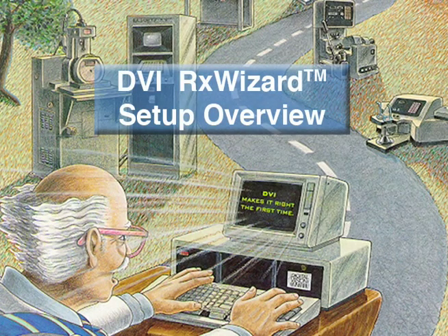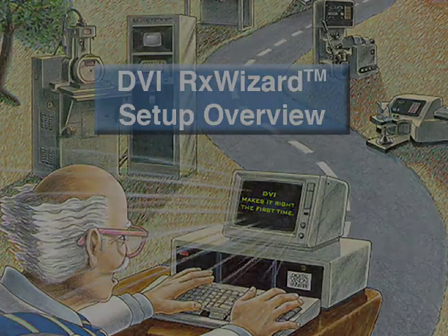Before you begin an installation of the DVI RxWizard, first check to see if you have used the RxWizard before. It may also be known as Remo or iConnect. If you have, and you have a copy still installed on your computer, you only need to find your account's username and provide it to the lab you wish to do business with.